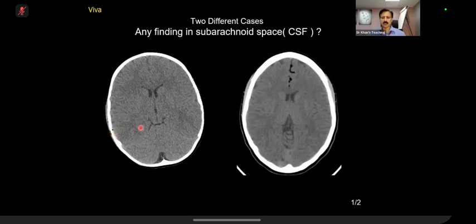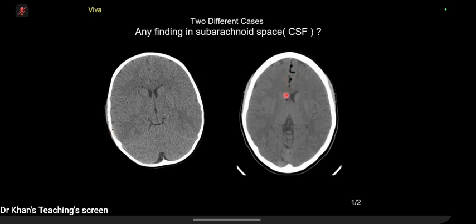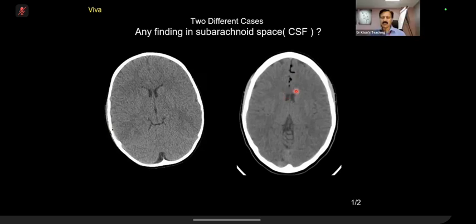How can you confirm this? Okay, what is this hypodensity? It's again most likely air, but fat can again have the same kind of appearance. We'll have to go through. Excellent, excellent. So this is a ruptured dermoid, by the way, which is an exam case, and this is pneumocephalus.